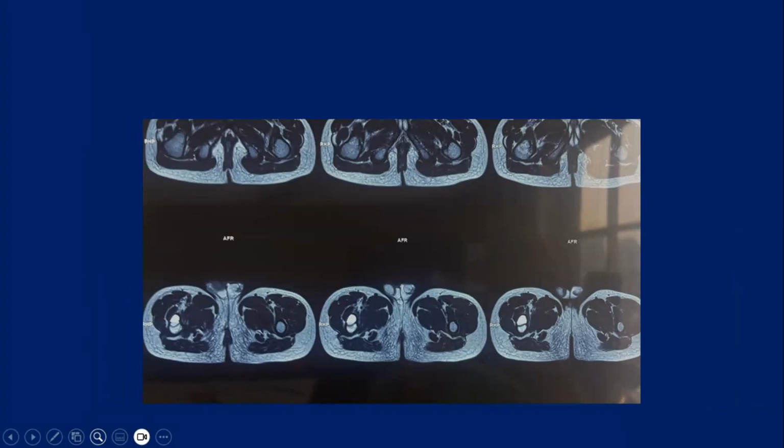One thing we can say is it's non-aggressive. And two, it's a cystic lesion with a fluid level, a blood fluid level. So the dilemma was, because of the single fluid level that we saw, we were thinking of a cortical or surface ABC. But again, it was an incidental finding because the child did not have any pain. He was just limping, and that is how this was detected. That is a little unusual with ABCs. Usually they are painful.